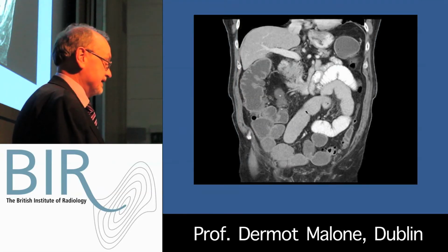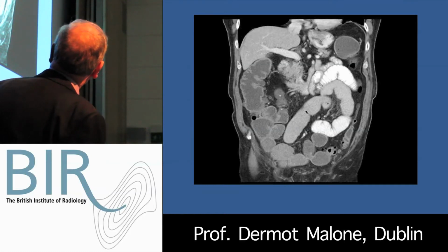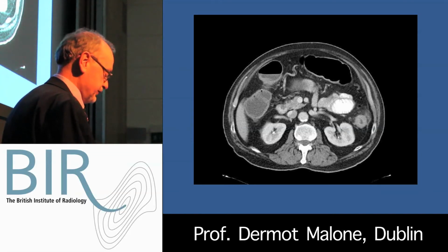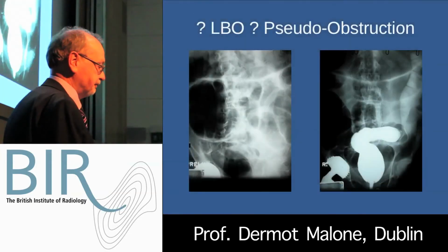Here's an example. This is a patient who's got quite distended small bowel and a moderately distended colon. This is the region of the ileocecal valve, and there's small bowel content, small bowel distension, moderate colonic distension. The left colon is quite decompressed, and the cause of the obstruction is a carcinoma near the splenic flexure, in the descending colon. Again, the advantage of running retrogradely through your bowel obstructions and not solely relying on the top-down analysis.